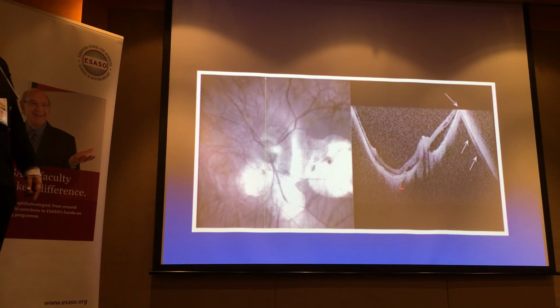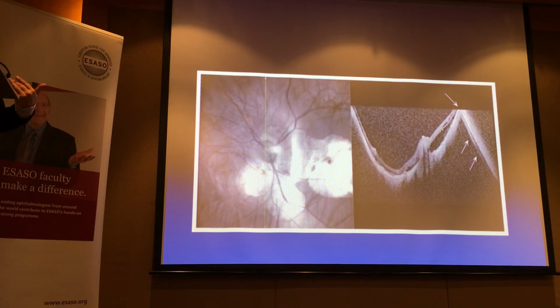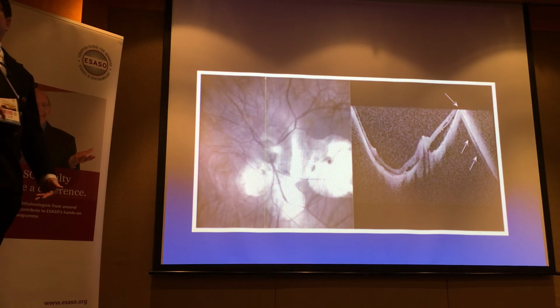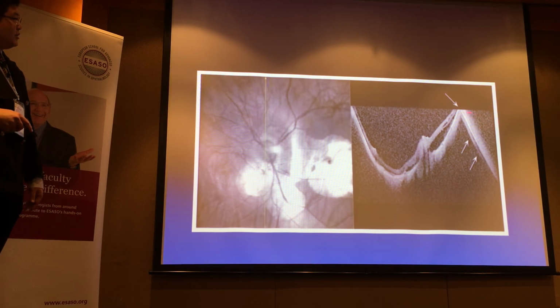And once it gets to this point, this is not because the eye has folded over on itself. Okay? I mean, unless you did a terrible buckle or something, right? If anyone has seen this, please let me know. I'll be curious to see what that case is. This actually continues up there, but it's a reflection. Okay, so this is an artifact, and of course it also means that it's all reversed, isn't it?